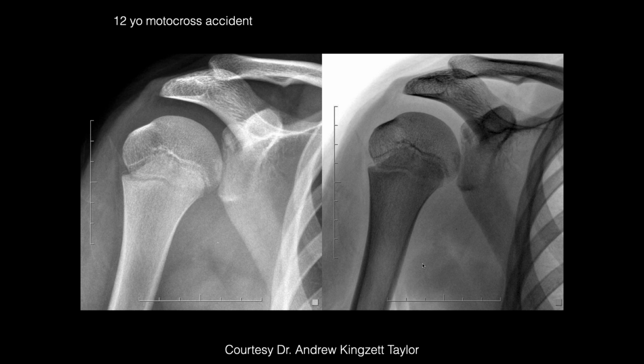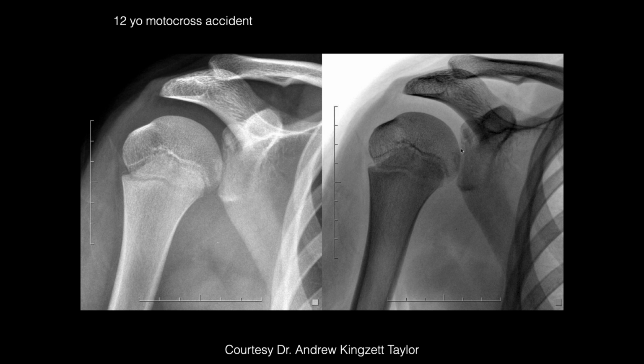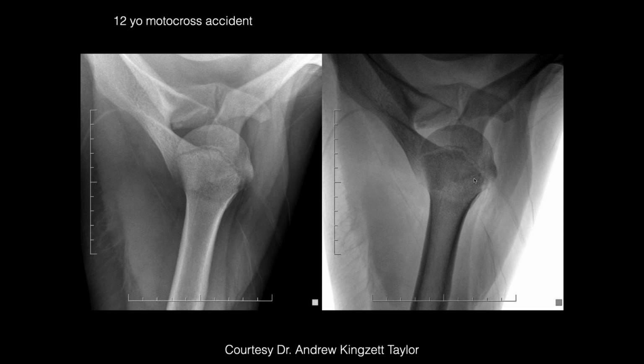So, yeah, well, this is probably the growth plate. No, I'm talking about the glenoid, it looks a little irregular there. Yeah, I thought that was a fracture. But you can also have a growth plate in through there. What do you think it is? I'm just looking at the humerus there. It looks kind of irregular along that lateral margin. The glenoid. What do you think?